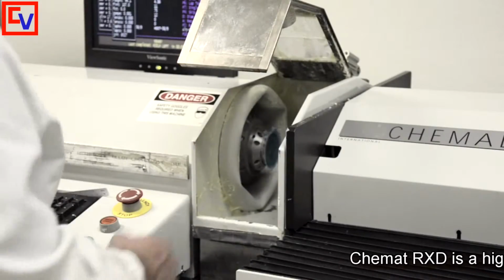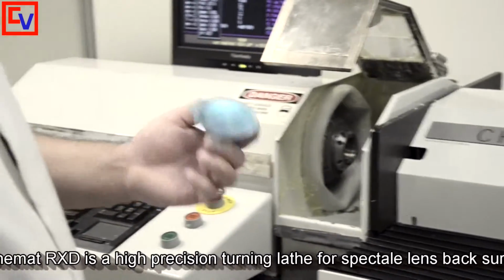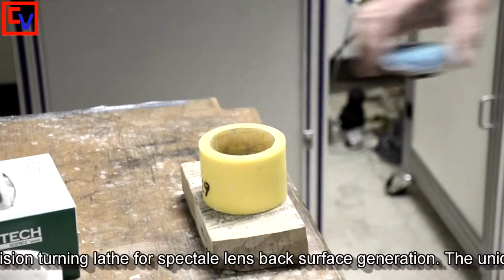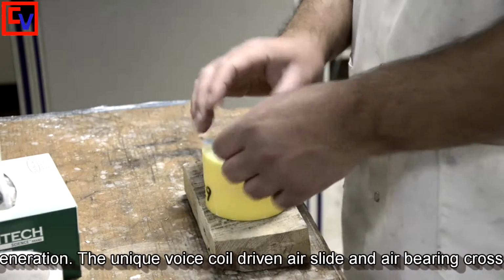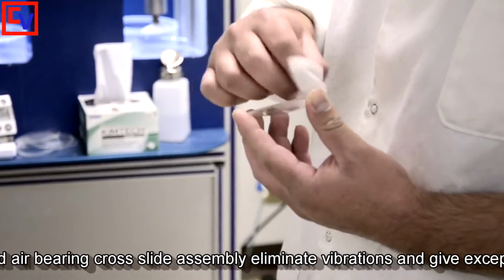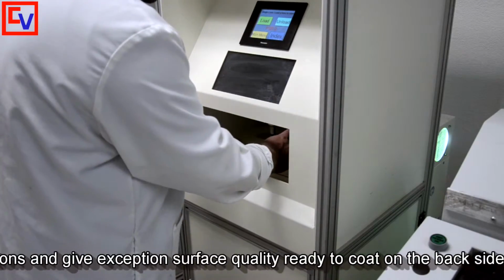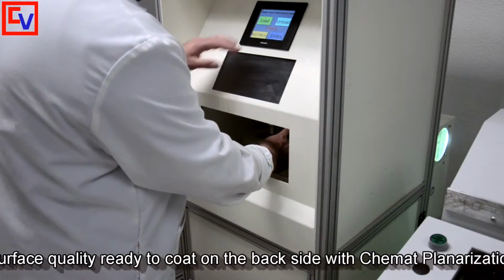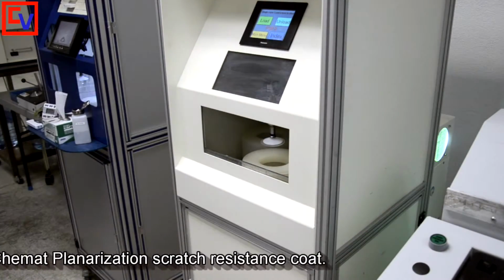So once the lens is finished, go ahead and take it out, and there's a finished lens. And then you come and you deblock your lens. Once you deblock your lens, take off the tape, and then you clean it with alcohol. You come over here to your hard coater machine, and you hard coat the lens.